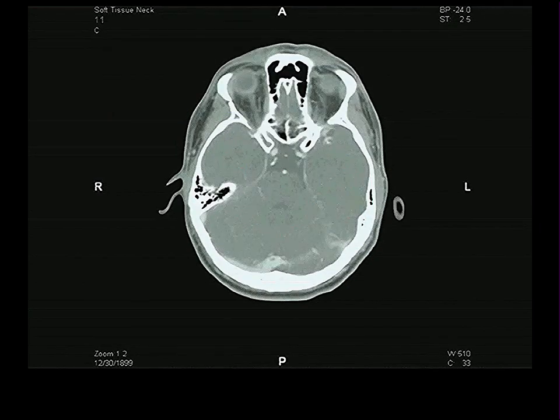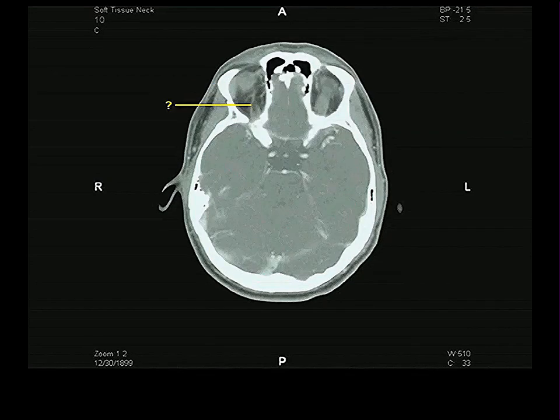We come superiorly. These must be, I don't think these are labeled, the lacrimal gland on this side and the lacrimal gland on that side, which sit very far forward in the orbit, superolaterally. Here is something which is definitely superior to the optic nerve. Now, it crosses the optic nerve, but it doesn't zip across. I mean, that's not the anatomic term. But the ophthalmic artery makes a very short, quick crossing of the optic nerve. This is making a leisurely crossing of the optic nerve.